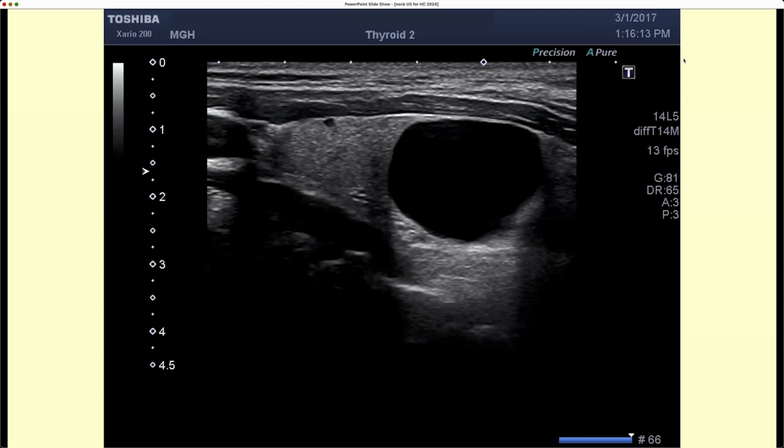A quick taker on this one. The cystic, anechoic, regular margins, no echogenic foci. Right. And what's this? Posterior, like a shadow. Well, it's not a shadow because a shadow is dark. We call it posterior enhancement, which is the opposite of the shadow.